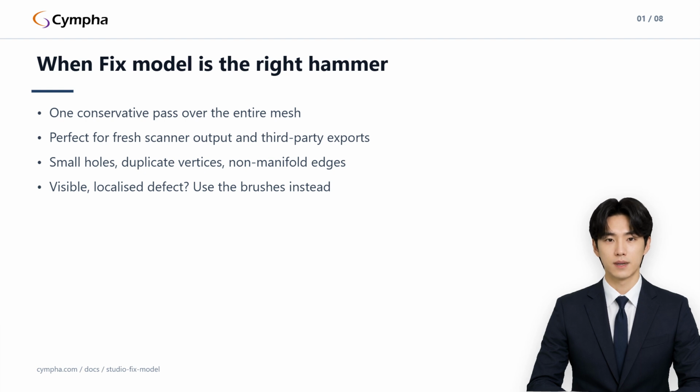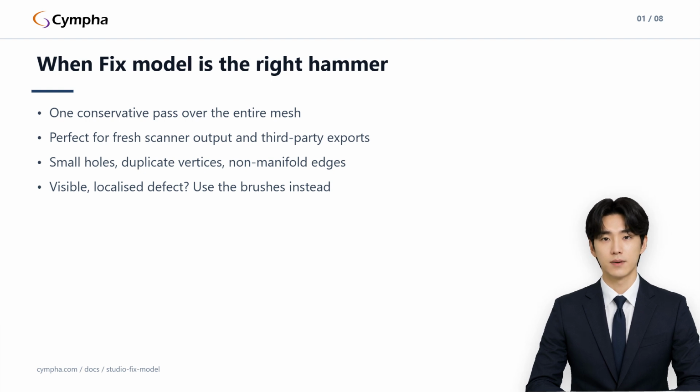3 things before you click anything. 1. A mesh in the scene via Add Model on the top toolbar, open optical scan file in the hamburger menu, drag and drop, or a link.